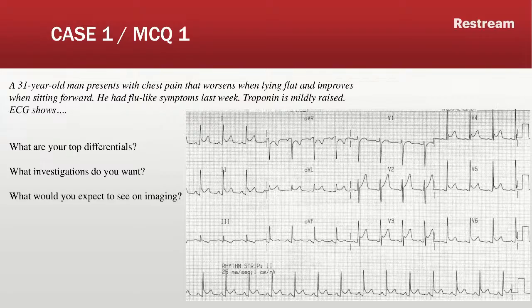If you look at the ECG, you can see there's widespread ST elevation in leads 1, 2, lead 3. There's some ST elevation even in leads AVR, AVL, AVF, there's some slight elevation, and V2 and V3. So almost even V5 and V6. So almost ST elevation in all leads. Okay.